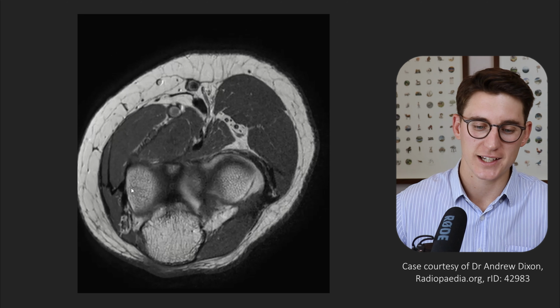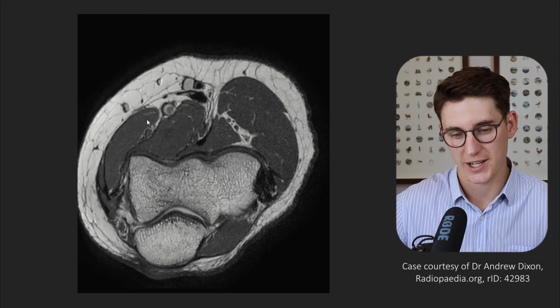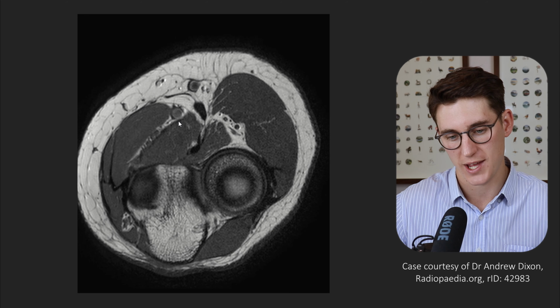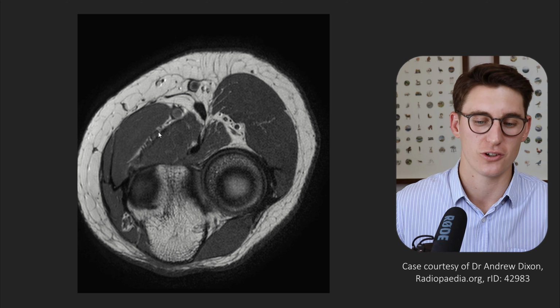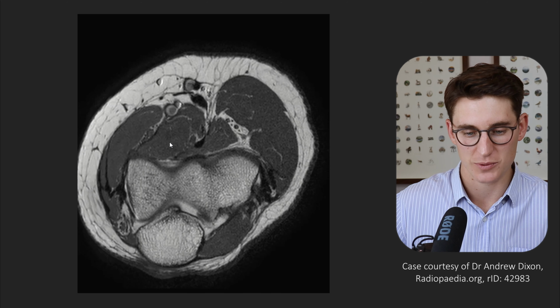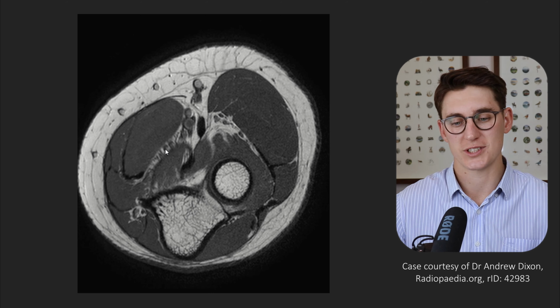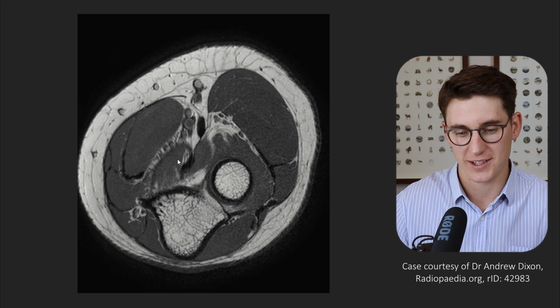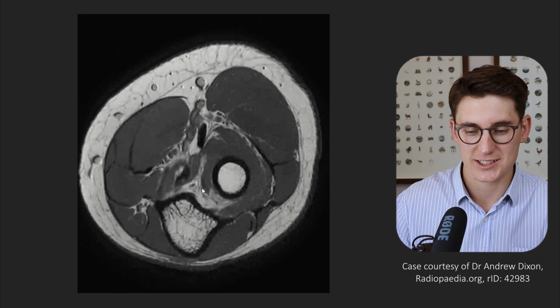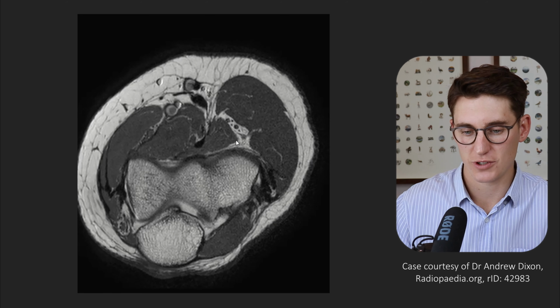On the medial side, let's head back up to the elbow joint, find our medial epicondyle, and see our pronator teres coming around here. There's 2 heads of the pronator teres. In between that is where our median nerve runs. That median nerve, as we head further down, is going to embed itself in that pronator teres and also send off 2 branches. One goes off towards the carpal tunnel, supplying muscles of the hand, and another heads off as the anterior interosseous branch. So those are the 3 main nerves.